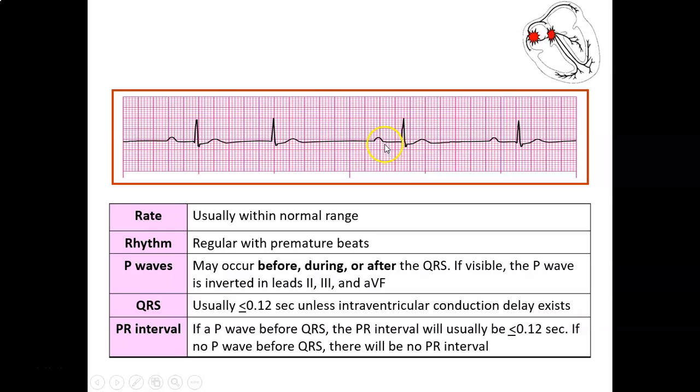The first, third and fourth complexes are coming from the sinus node, but the second one is coming from the AV junction, from the AV node. So there is an ectopic focus which tries to take over from the sinus node. This naughty child fires its current in complex number 2, but the SA node, the father, is strong, so it keeps on controlling the electrical events within the heart. But in between, this ectopic focus, this naughty child, fires itself.